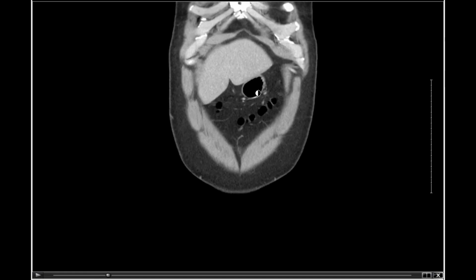And I got a big gas bubble here. So gas bubbles are going to be indicative of the GI tract. So the stomach, various parts of the intestines are definitely going to have some gas bubbles in them. And since I was going to the hospital for severe abdominal pain, I wouldn't be shocked if there's going to be a lot of that as we work through it.